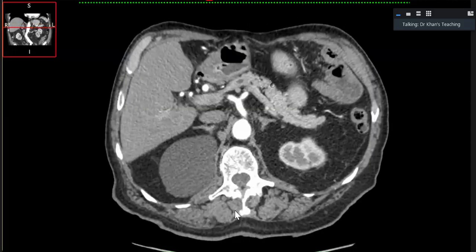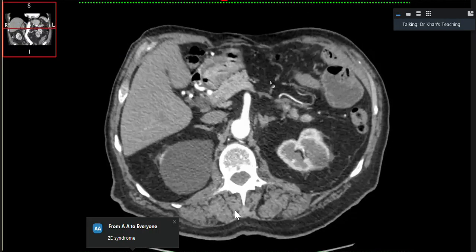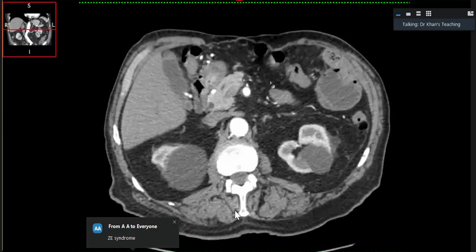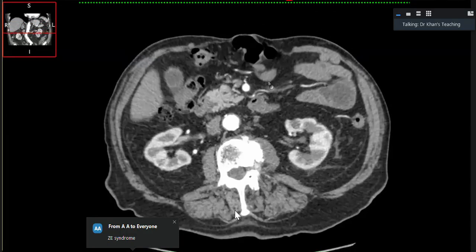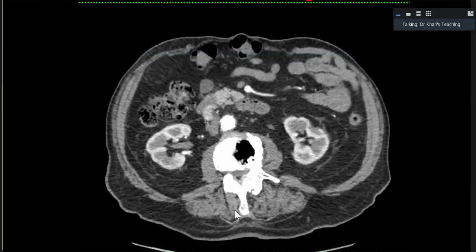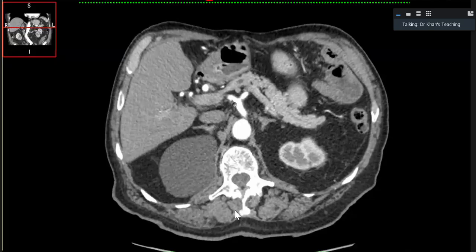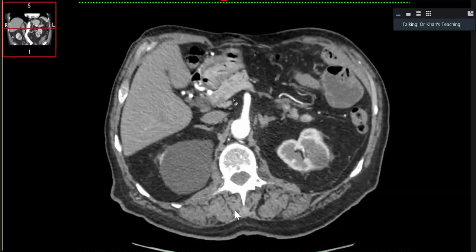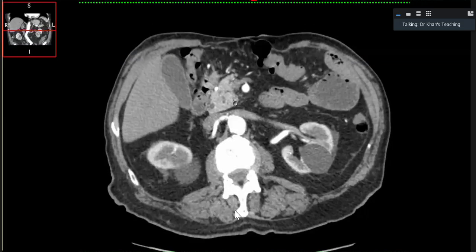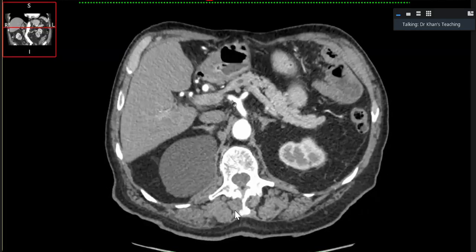I'll tell you. Now, in this particular case, you went through your angiography protocol, which was good. You ruled out everything happening in the gut, and then you picked up this thing. Now, here comes a bit of fine touch. If you see the anatomy, I've shown you quite a few cases of the duodenum, the pancreatoduodenal junction and things like that today. So my idea was to pick up cases in that region so that your anatomy, your protocols, your eyes are developed in this region particularly.